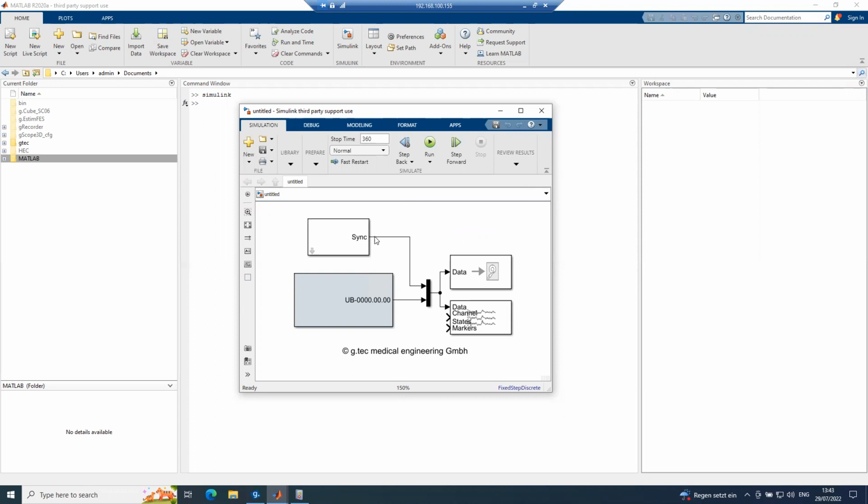Now we decided to make the interface easier to understand, so we just removed this output, but the data is available in the Tobii Pro Analyzer software. You can access the data from there.